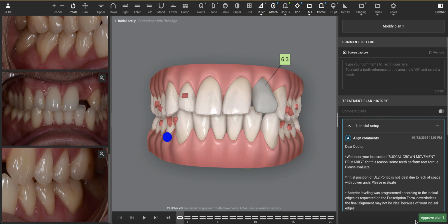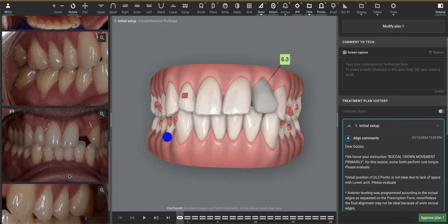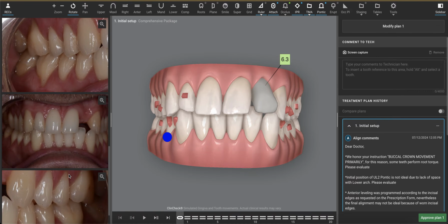Good afternoon, Doc. We have an Invisalign case that we want to plan well, in great part due to the patient's compromised periodontal status. Evidenced by the photos here, I think we can get a sense that the patient has a pretty thin gingival biotype and already has recession. So the last thing we want to do is increase the problem through orthodontic movement without some sort of long-term plan.